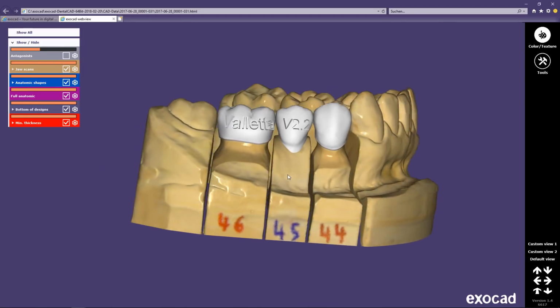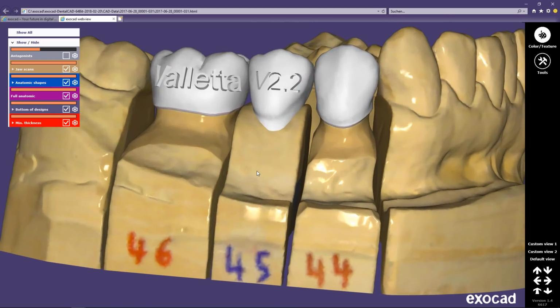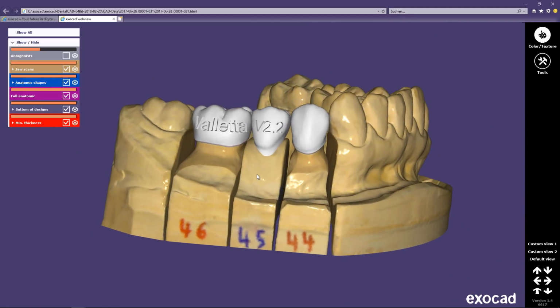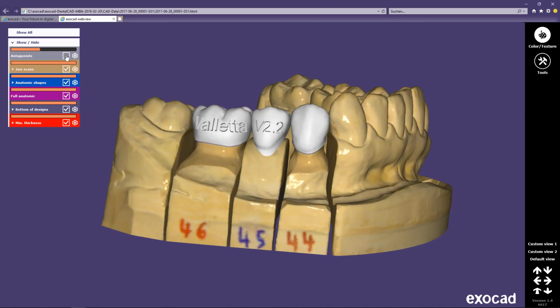exocad WebView and HTML supports all types of open mesh data and point cloud data. For example, .stl, .obj, .ply, .off, .eoff, .xyz, .xyznb, zip files containing mesh data, and exported DentalCAD HTML scenes.